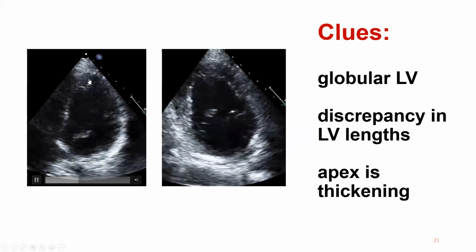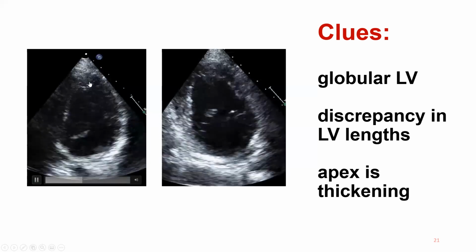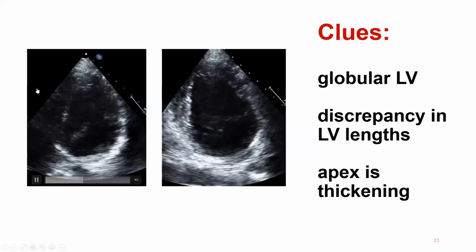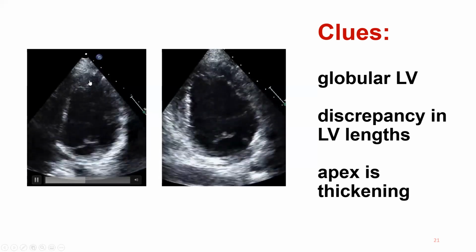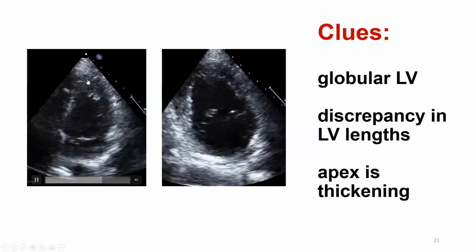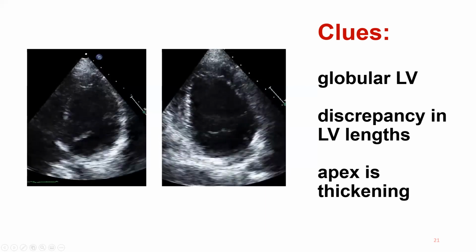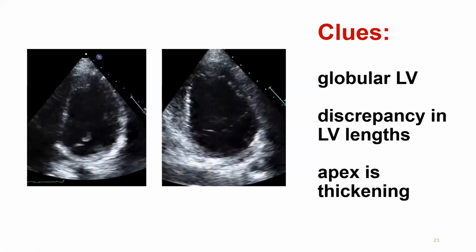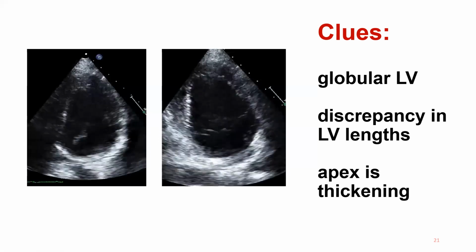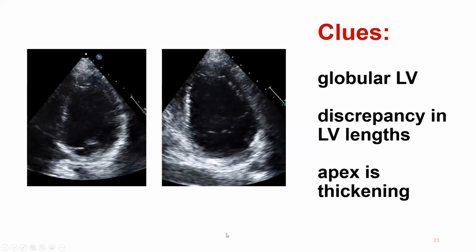Now, of course, there are conditions where the apex is thickening legitimately. Endocardial fibroelastosis comes to mind, as well as apical hypertrophic cardiomyopathy. But for the vast majority of echoes you read in your laboratory, if the apex is thickening, your four-chamber view is foreshortened. And again, foreshortening along with endocardial difficulties in measuring the endocardial edge will contribute to underestimation of left ventricular volumes by two-dimensional echo.